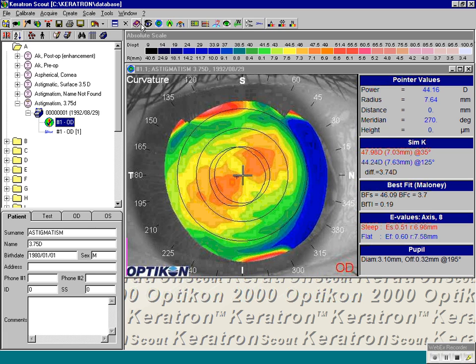In this section, we have map display types. If you had a map up on the screen or had something selected, and had a file box selected in the Database Explorer, you can click Photo Process Map, and it would process that map into a rings image. Curvature map, which is default, axial map if you need one, and a spherical offset with a vertex. Next is the difference mapping. You would do post-procedure minus pre-procedure, which will give you the difference in shape.